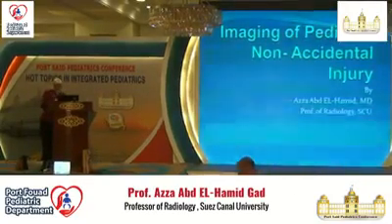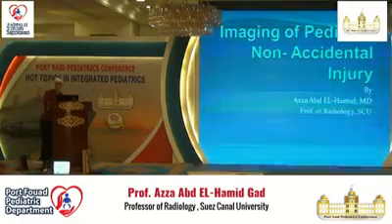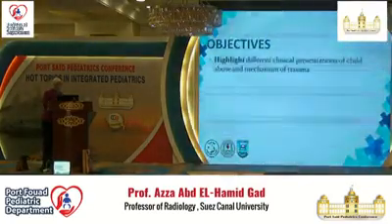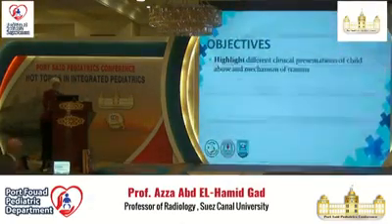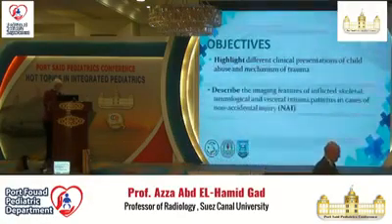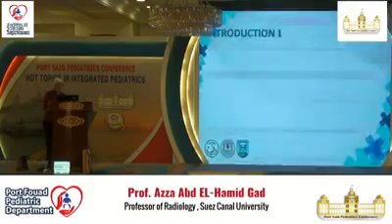We will try to talk quickly. Imaging of pediatric non-accidental injury, also called child abuse. During this talk we will highlight different clinical presentations of child abuse and mechanism of trauma, and we will describe the imaging features of inflicted skeletal, neurological and visceral trauma patterns in cases of non-accidental injury.